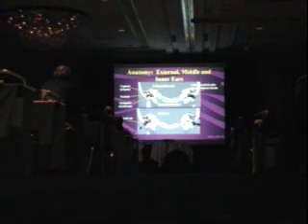Prussak's space is the space between the ossicles and the scutum. Why is that little air space so important? Because that's where cholesteatomas live. By the way, looking at an axial image, if you just find the middle ear ossicles and then find the bone lateral to that, you know that's Prussak's space. So it's easy to find the scutum and Prussak's space on an axial image. Just find the ossicles, go out laterally.